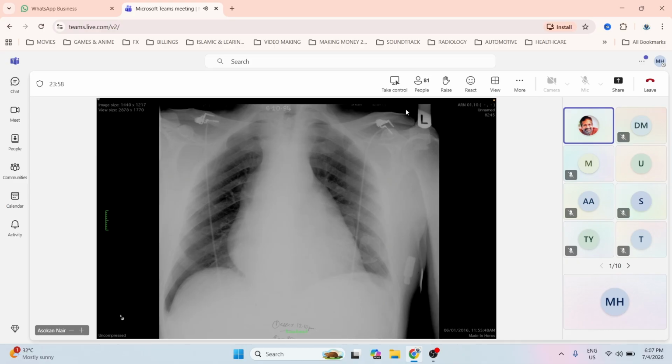And valvular heart disease doesn't appear like this, all right? Cardiomyopathy, possible, but doesn't give a globular shaped heart. Cardiomyopathies and valvular heart disease usually will have pulmonary congestion, so the vessels all become enlarged, all right? And Epstein anomaly is not like this, all right? And what's the other one you gave? Okay, and congestive heart failure, okay? Yeah, this is also not like this.